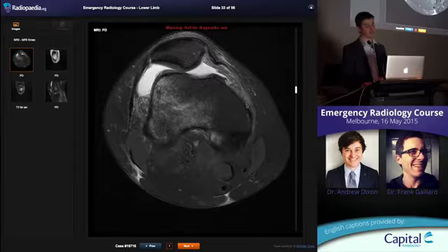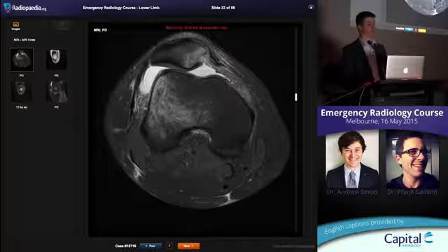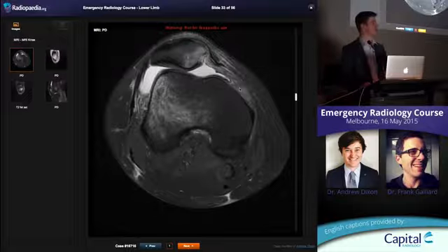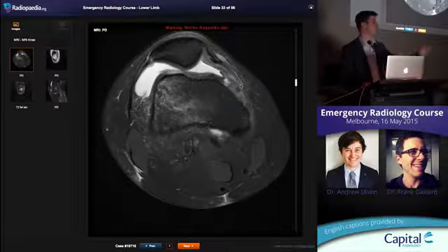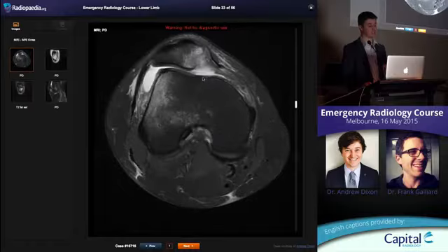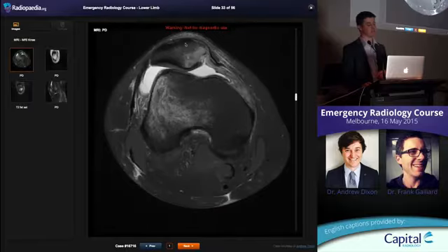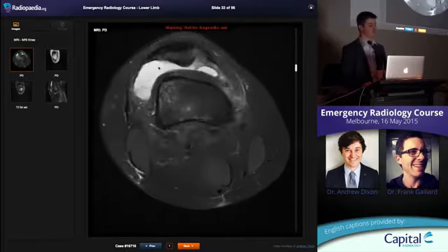It should continue along and insert just in front of the medial collateral ligament here. In this case, it's very hyperintense and irregular in that area. So there's been a high grade tear of that medial patellar retinaculum at the femoral attachment. That's associated with ongoing instability. Once you dislocate once, you're going to keep dislocating. It's also good, the MRI, to look for underlying risk factors for patellar dislocation. You can see this patient has a very shallow trochlear groove. It should be a nice deep groove. And obviously the patella is also subluxed out laterally.